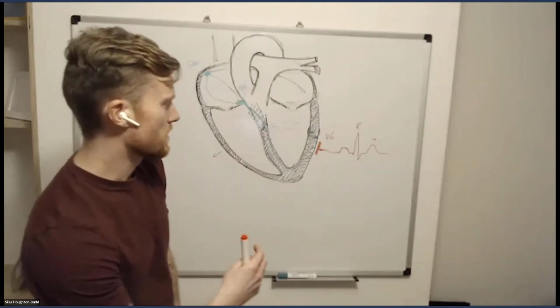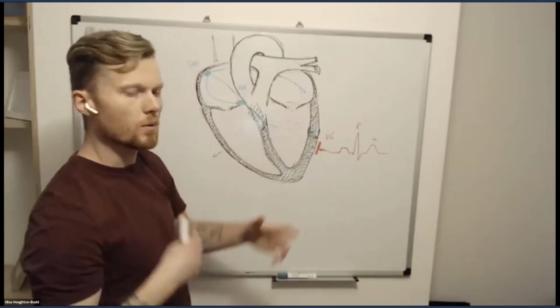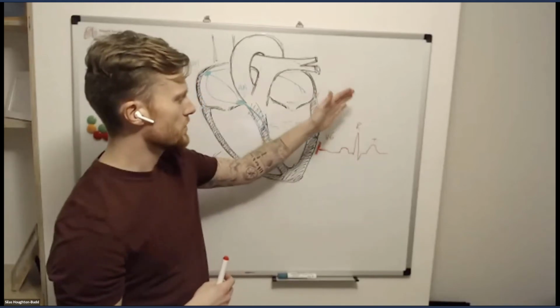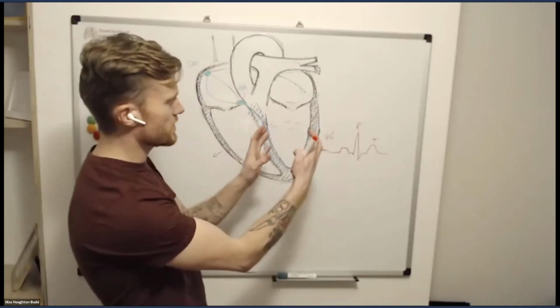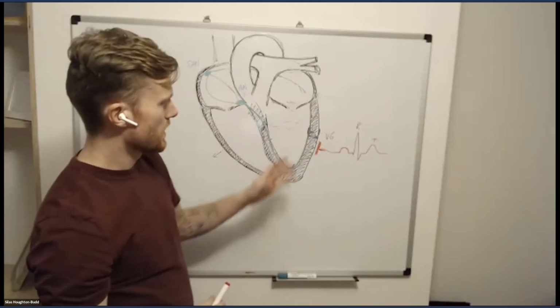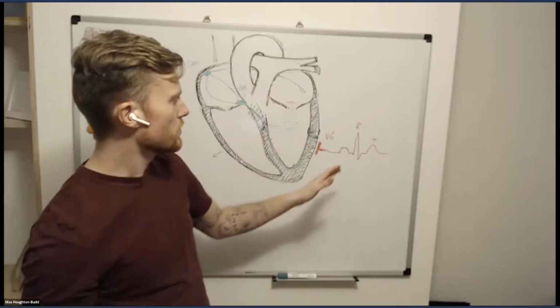People will know that sometimes in ischemia, where this repolarization is not working normally, you might see T wave abnormalities such as hyperacute T waves or T wave inversion. And essentially what that is showing us is that the T wave, the repolarization part of the cardiac cycle, is dysfunctional, and so it's causing those T wave abnormalities. So concordance is what we're after.